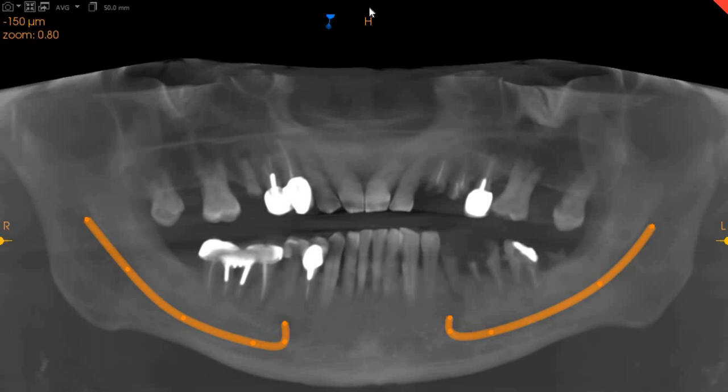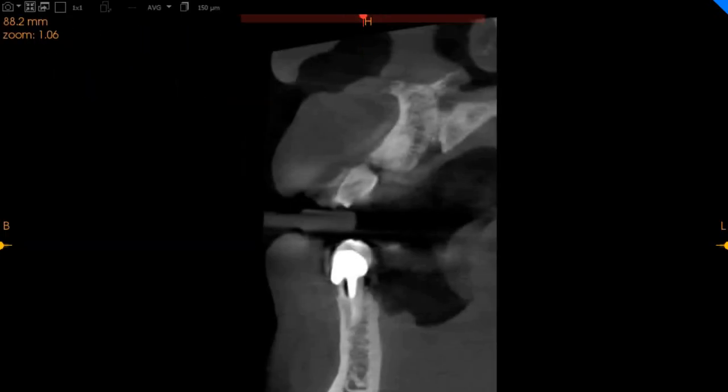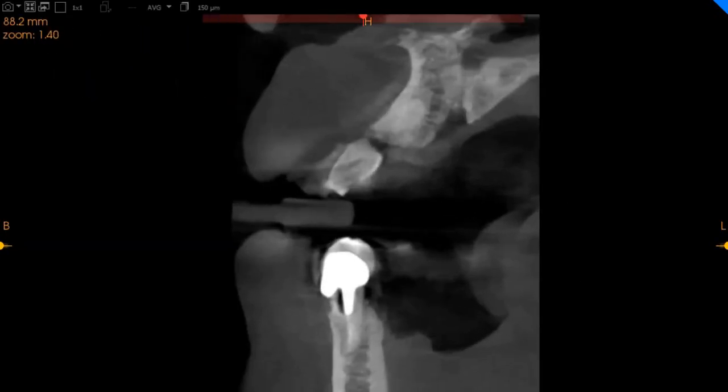The areas of interest are all the BDRs and endodontic treatment, or extraction and implants. We're starting with the 4-6, the 4-5, the 4-4, 4-5, 4-6, and 4-7. This is the transaxial view, which is basically the proximal view.